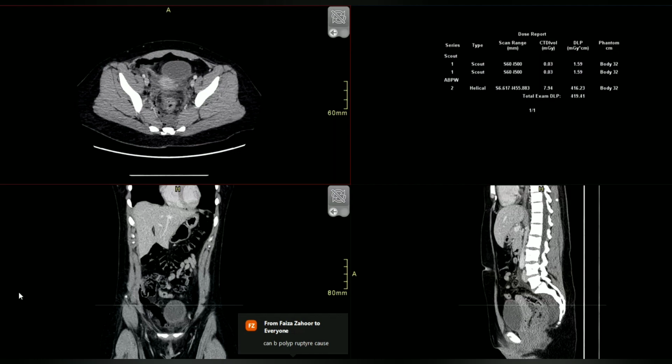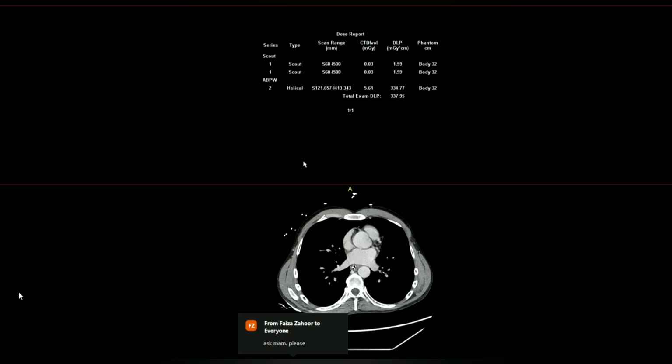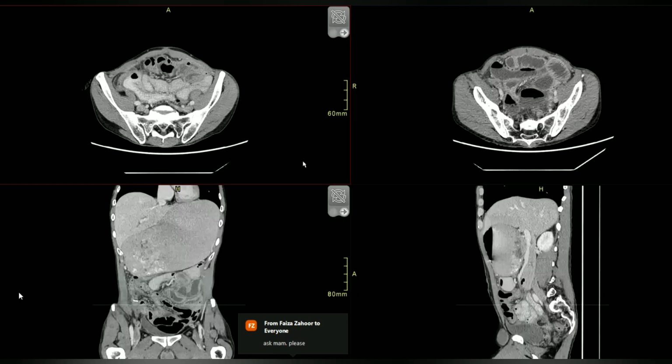And rectal contrast can be administered to further... I think that the imaging has told us that she has a fistula. So we leave it to the surgeons. We don't always have to say to do an investigation. It's not necessary. We have to say the appropriate investigation, if you understand what I mean. So surgical consult is appropriate. And then if they want to do something further, they're going to tell us. So very good. Excellent attempt.